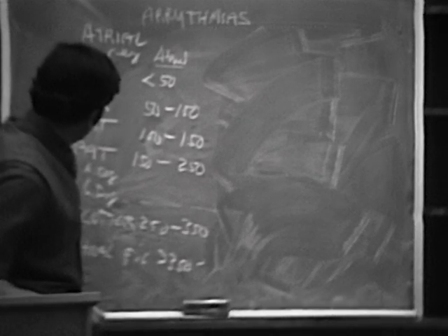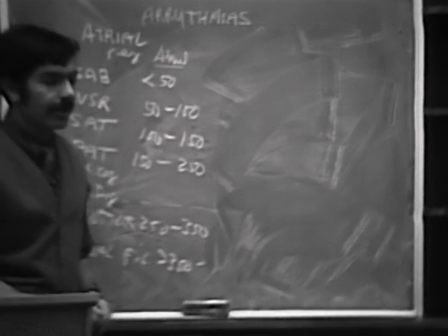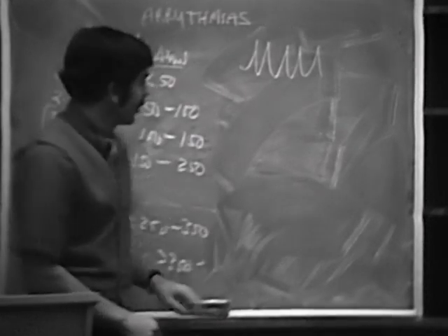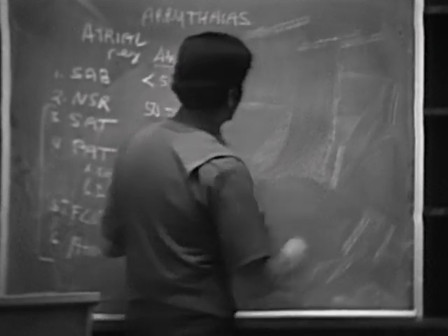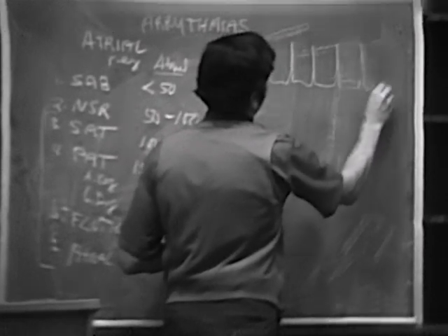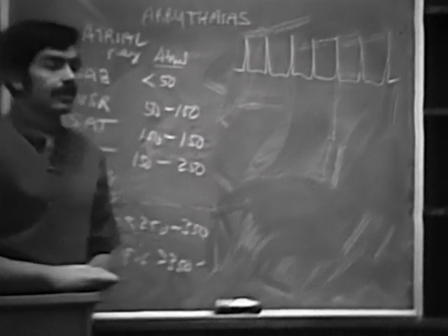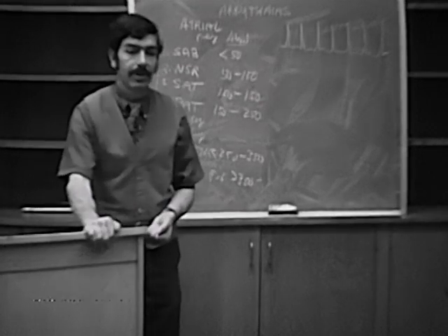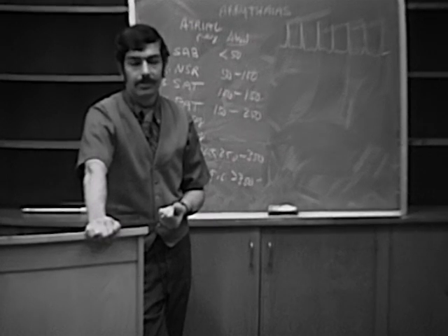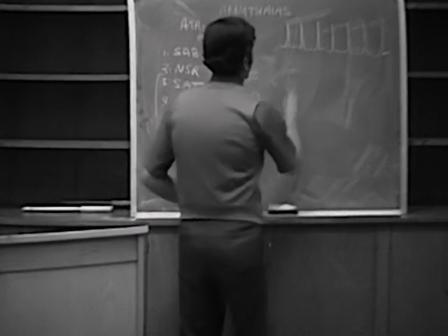So then how are we going to differentiate these? We've taken our best leads that we have available, and all we see in the electrocardiogram is something that looks like this. Right? Goes very fast. Well, maybe not like that. That would look like ventricular tach. Say it's just going like this. Right. You say, are these P waves, or these T waves, or what are they? So how would you differentiate? What maneuver can we use to help us differentiate? Very valuable maneuver. Carotid sinus pressure. Okay, carotid sinus pressure.